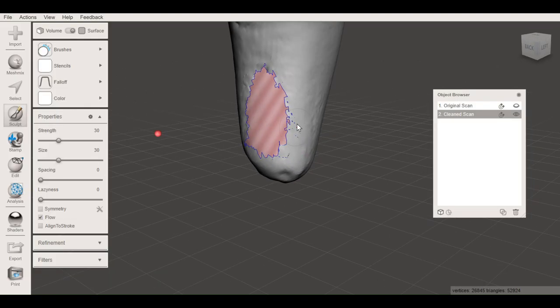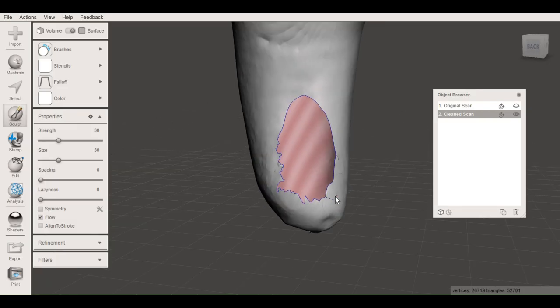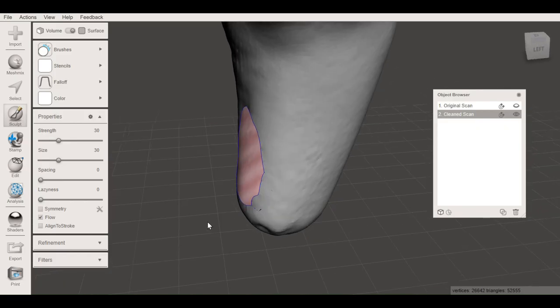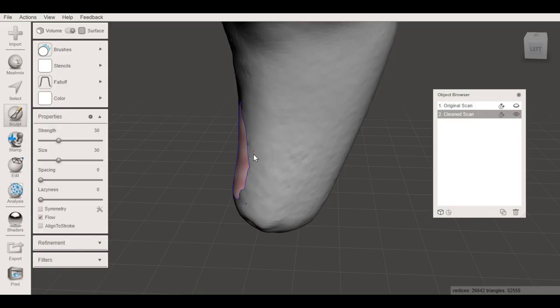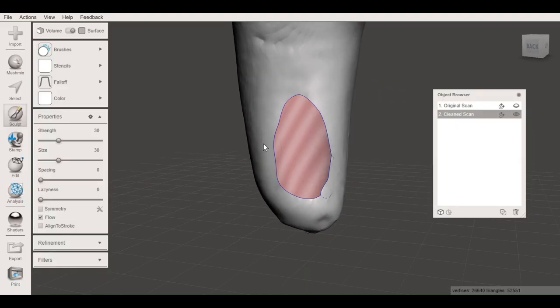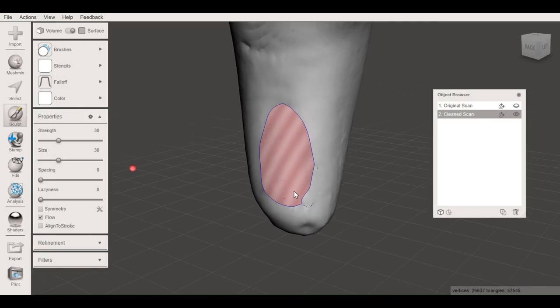Now I'm just going to left click, and while I'm dragging around this whole opening, the hole is actually going to start to close itself. Meshmixer does a pretty nice job of approximating that part of the scan, so you'll still get a rather good looking aspect of this hole when we're done with it that is going to follow the patient's anatomy relatively well.